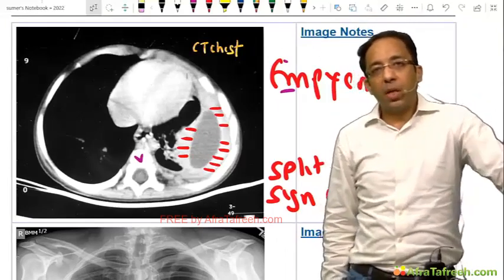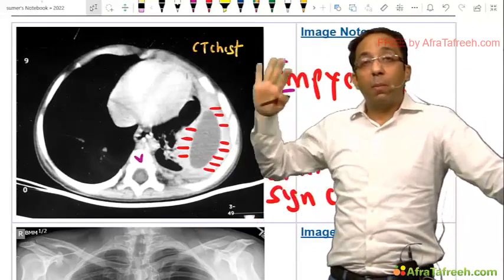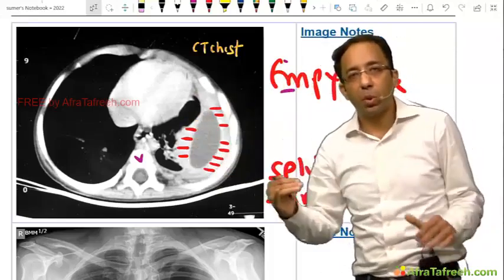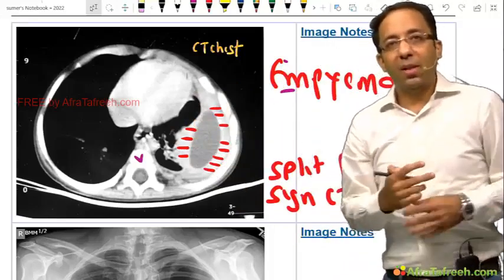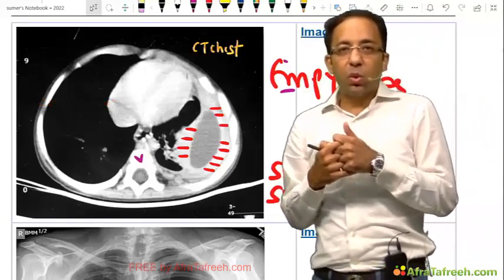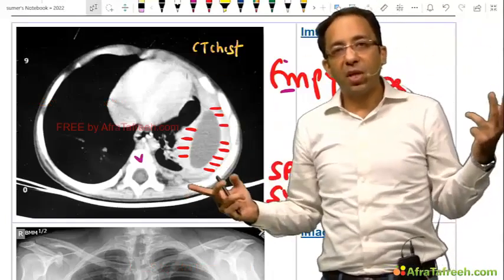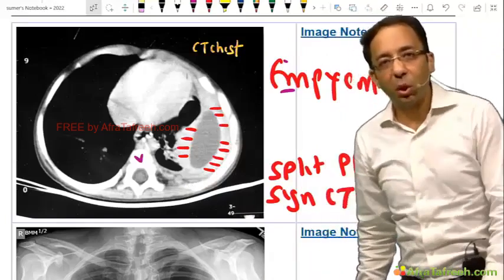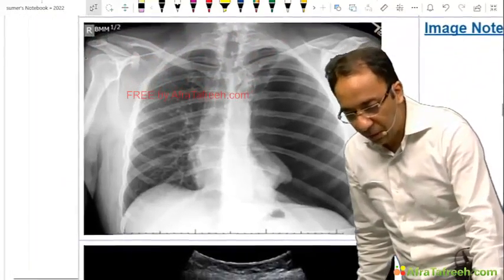Now the problem is, medical students think that radiologists are remembering the image and identifying it. But what we are doing is a step-by-step approach. We look at the anatomy, we think about the pathology, come to the diagnosis. And that is how I am trying to teach you to connect the dots. That is why I told you radiology is going to be tough initially, because it is a multi-compartment kind of science. We see a lot of things in the entire body, but that is where the charm of radiology is. I will try to explain it to you.